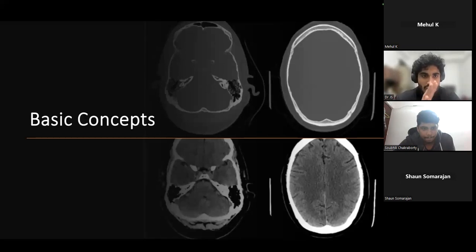You are seeing your eye can see 7 colors visible in a visible spectrum. But the X-ray or the CT scan eye can see only black and white, and there are a lot of shades of gray. So this is a world of black and white with lots of shades of gray. And our eye can only distinguish between one shade of gray and another shade of gray.